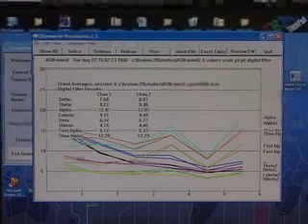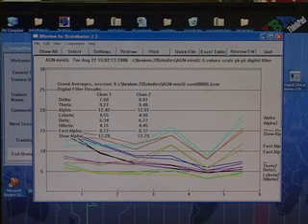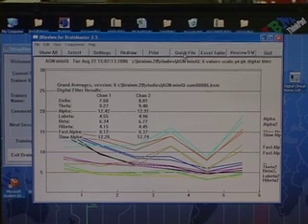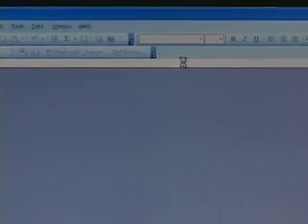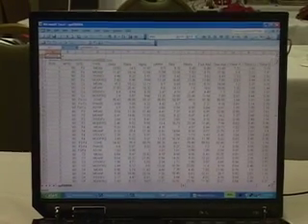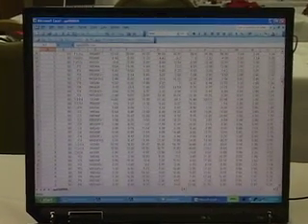And again, this is the one where, remember, we saw that the lines were nice and parallel. This is typical for a mini-Q assessment. Let's begin the process of saving the data. All right, so the first thing you have to do is click on Quick File. Okay, just clicked on Quick File. Now I'm going to scroll down the CSV file.